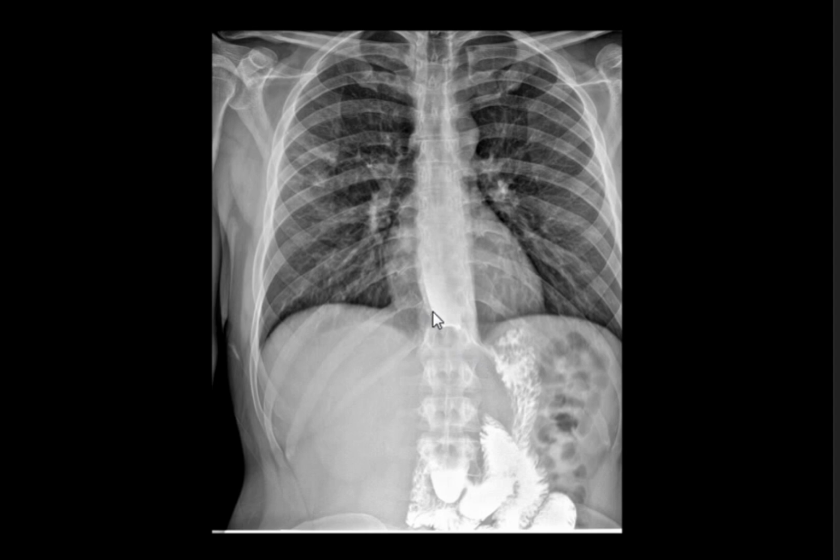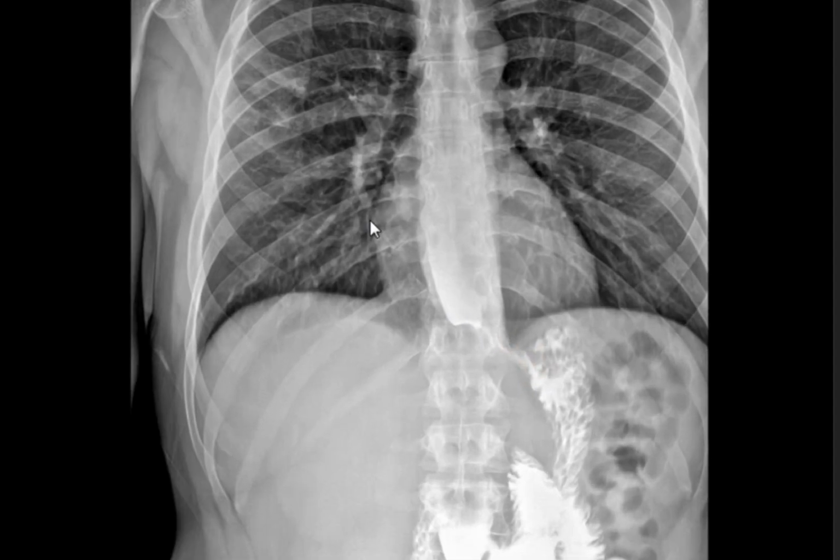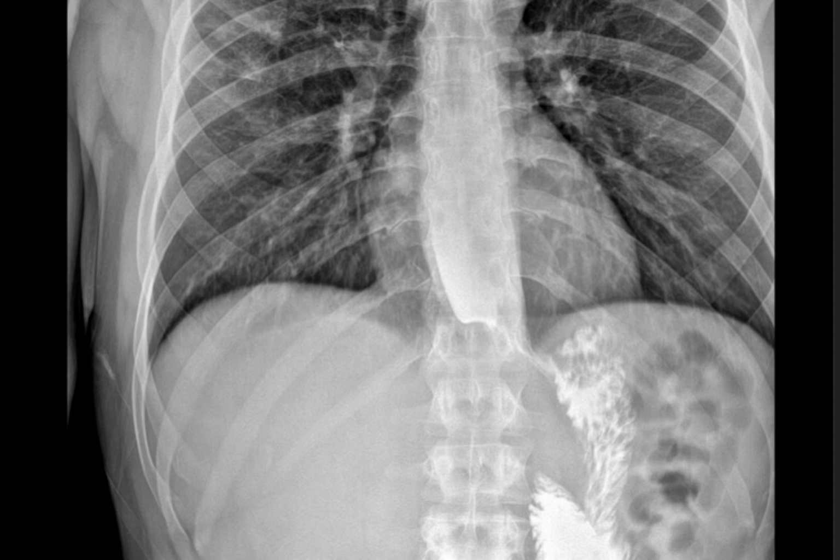So, the shape at the end, is it an apple core lesion? No. It's a rat tail appearance. It's smooth and it's gradual. You can just open your mouth, go like that. It's smooth and it's gradual.